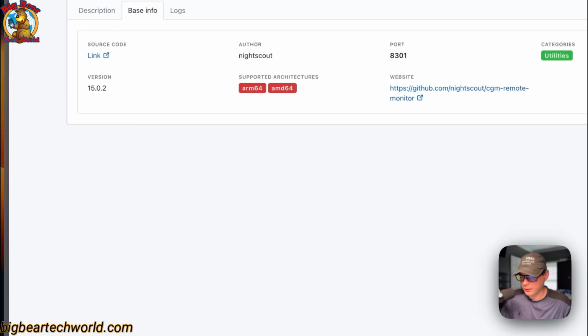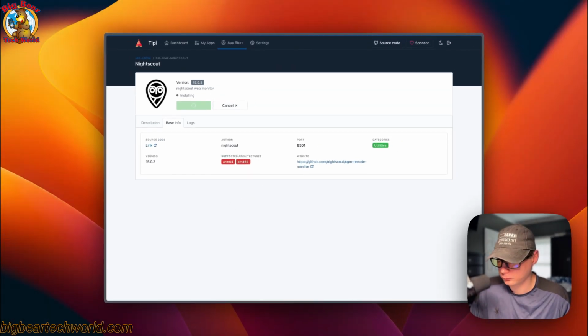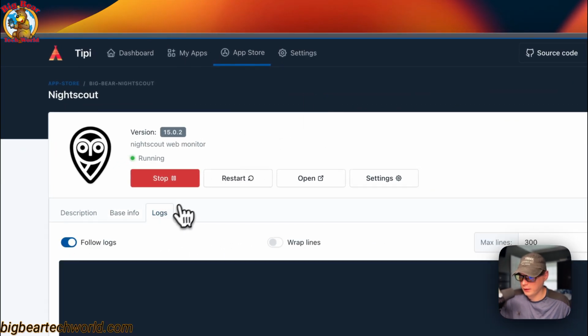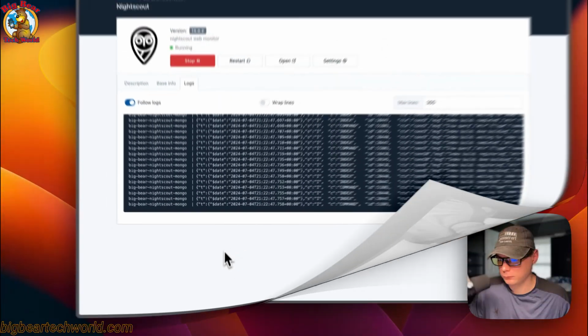And what this is doing is it's downloading the Docker image off the registry, getting it extracted, and getting it up with Docker Compose underneath, because this is using the Docker engine. It's also setting up the network and the volume. So now it's up and running, and it's good to go.